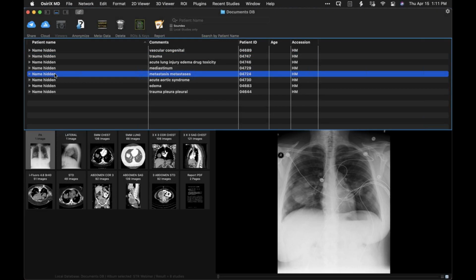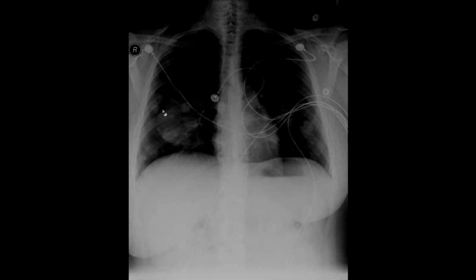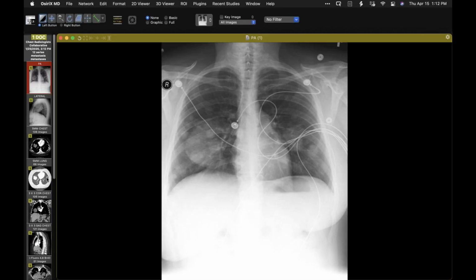I don't know if it was a PE study or something else. And it may be they're looking for a cause of the arrest, but they're very interested in any injuries, because we find these anterior rib fractures fairly commonly, and I've seen a few sternal fractures. They're very mild, but they're real, and they're usually looking, I guess, for a cause of it. But I've noticed sometimes the history is just CPR now.